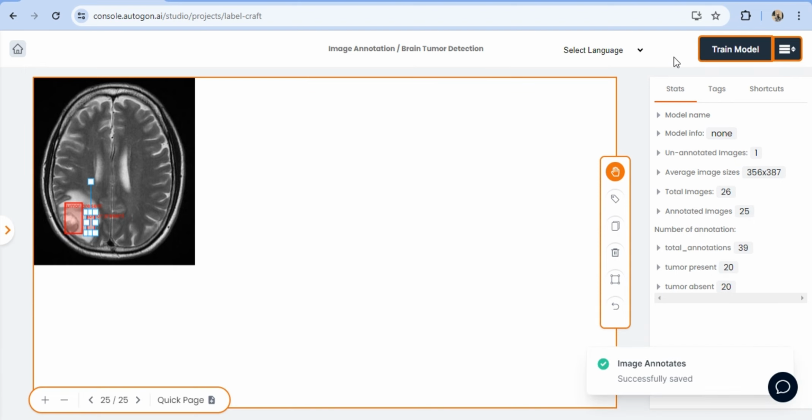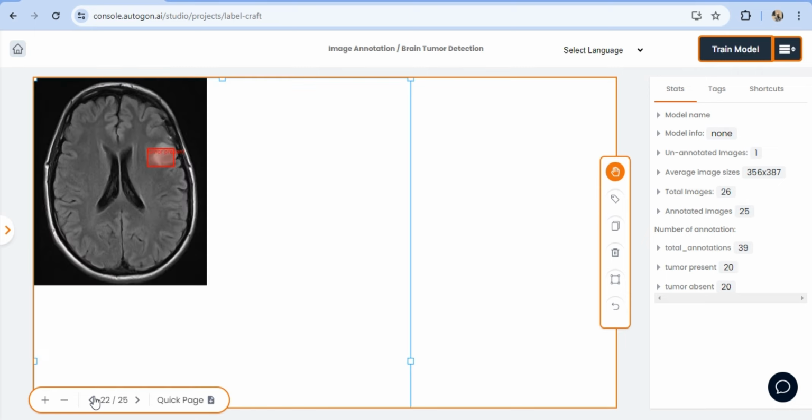I'm just going to keep it. I think I'm good with 20. This is enough. I'm just going to train my model at this point, and I'm just going to work with this now. Let's just leave it at this, and this should work. Yeah, this is not the most optimal way to build intricate models like this.